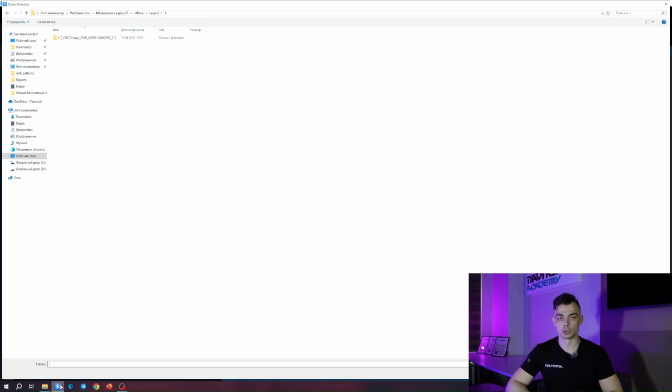So, as I mentioned in the previous steps, there are cases where we don't need a CT scan right from the start. This is really a matter of algorithms. I want to say that right away. And for now, you can just blindly follow along with me.